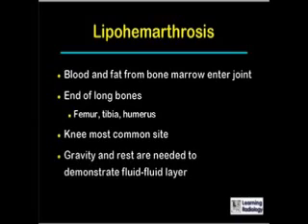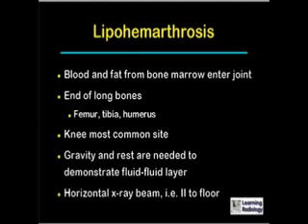They depend for their existence on the force of gravity and a short period of rest that will allow the blood to separate from the fat above and enable us to see the fluid layer. Most importantly, the presence of a lipohemarthrosis will only be seen when there is an X-ray beam that is directed horizontally, that is parallel to the floor.